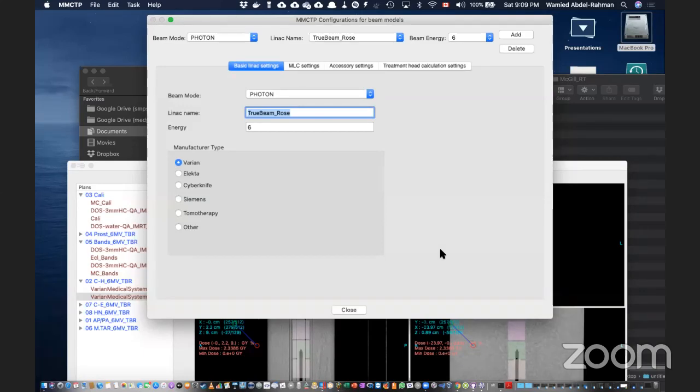But definitely, if you're using mmctp, you can copy files using secure copy, scp. That will do it. I installed mmctp in the same Ubuntu machine which is running EGS. Yes. So try, see if it's fine. If it doesn't work, this could be the problem.